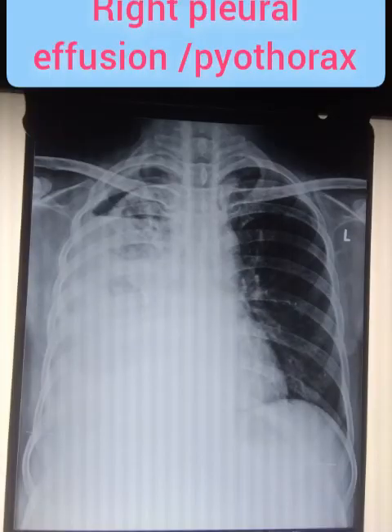Yes, let's discuss the next commonest finding, pleural effusion. In India, the 3 common causes of pleural effusion are tuberculosis, tuberculosis, tuberculosis. In this chest X-ray, you can see the right lobe, you can see the air fluid level. Fluid in the thorax is seen as white, entire fullness in the lung. The fluid in the lung can be pleural effusion, it can be chyle, or it can be pus. Accordingly it is called pleural effusion, chylothorax, hydrothorax, or pyothorax.